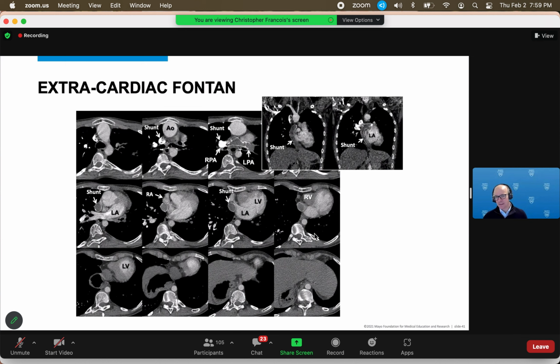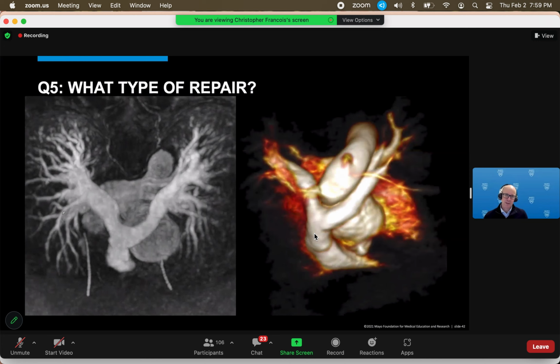What can happen is it can start to collapse, or you can develop thrombus inside. Most usually the material of these grafts is a Gore-Tex. Some people have used Dacron, but Dacron is thrombogenic, and so now they've moved to Gore-Tex grafts. They can become stenotic over time, especially at the anastomoses. And so when we're following these patients, that's kind of what we're looking for is thrombosis.